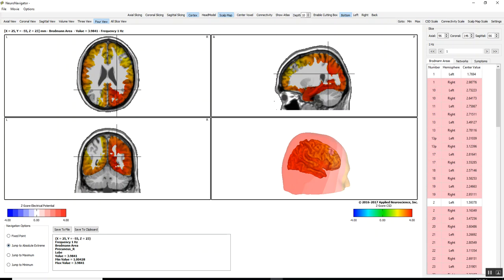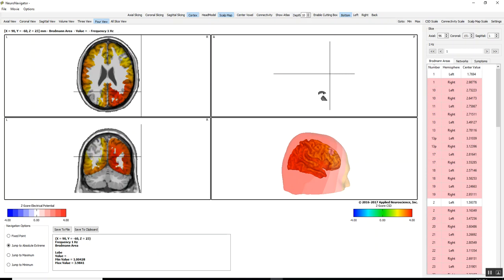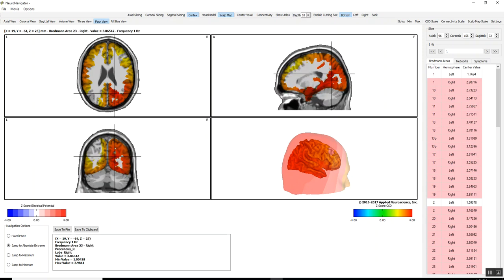This box here duplicates the box that's up here, but we're able to do a right mouse click and copy the image that's up there or copy the information in this text box. We can do that wherever we put our cursor. So you're able to put that now into a clinic report if you wish.